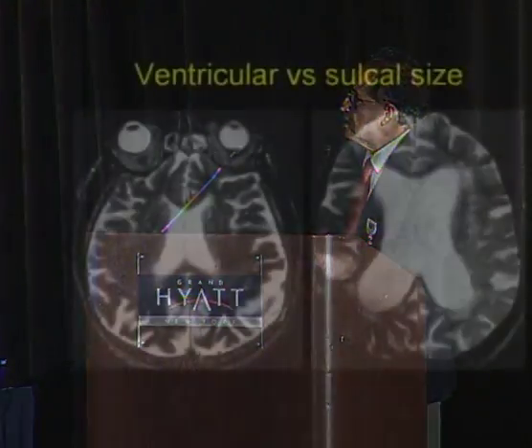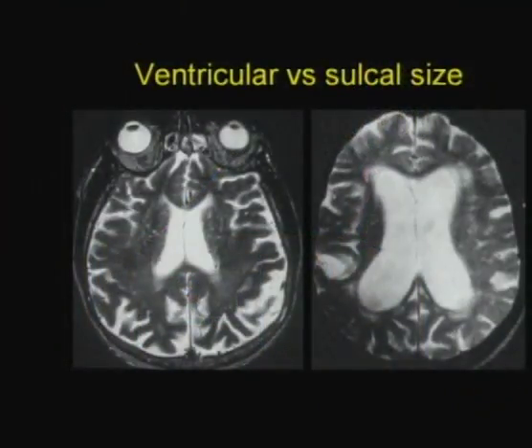Now, the comparison of a typical atrophy patient on your left, or parenchymal volume loss, and a typical hydrocephalic patient on your right. What does the hydrocephalic patient show? Very big ventricles and sulci, which are either small or vary in size from small to very large. Notice that the typical aging patient or atrophy patient does not have very big ventricles.